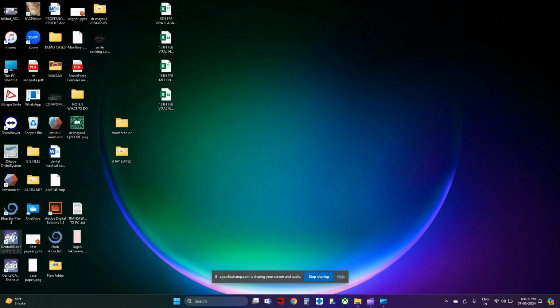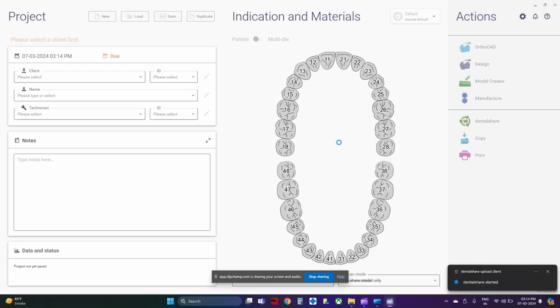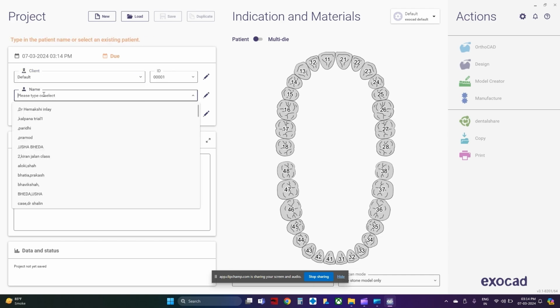Alright, so today we are going to do a wax up for an anterior implant case. The patient underwent a trauma and lost her central and lateral incisor. Luckily, the central incisor chipped exactly halfway through, which we could bond, but the lateral was shattered into pieces. So we're going to design, or mirror, the contralateral lateral incisor onto this, create a wax up, and then 3D print it, and then use that as an index to create a temporary tooth, or temporary cap, over the implant.